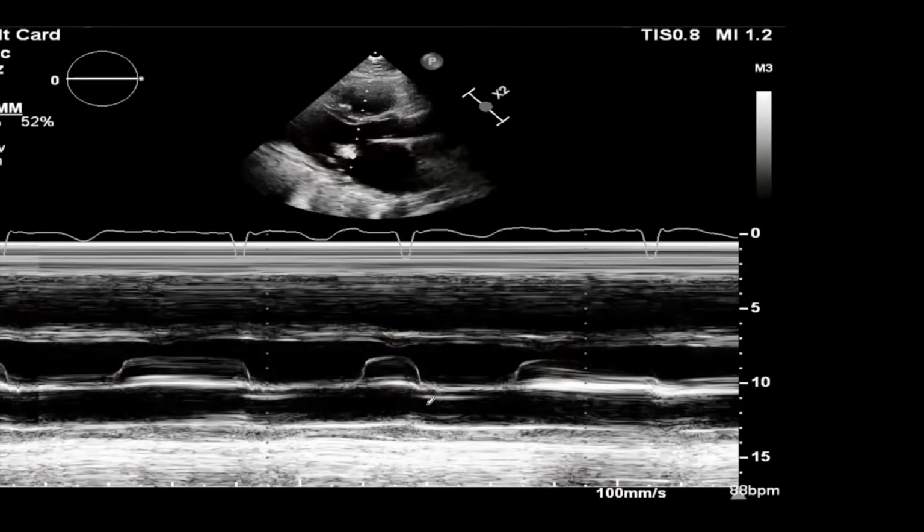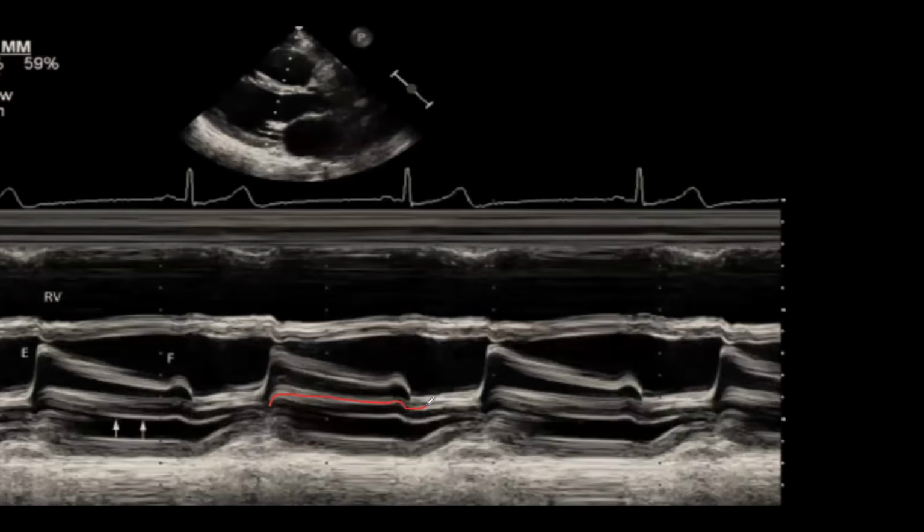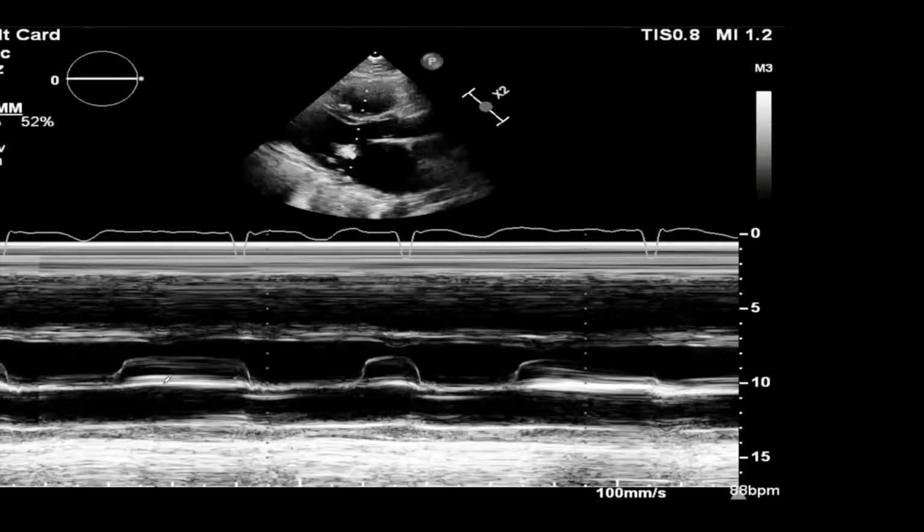So what if we have mitral stenosis? But what's the difference in this one? This one still has the atrial kick, still in sinus. However, this one, atrial fibrillation. We don't need ECG anymore, isn't it? Yes.